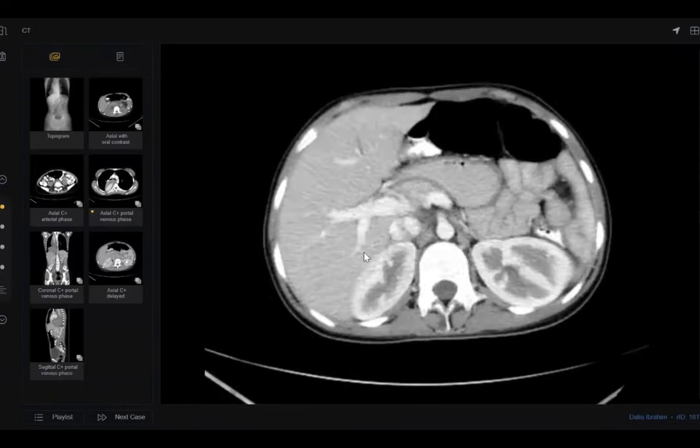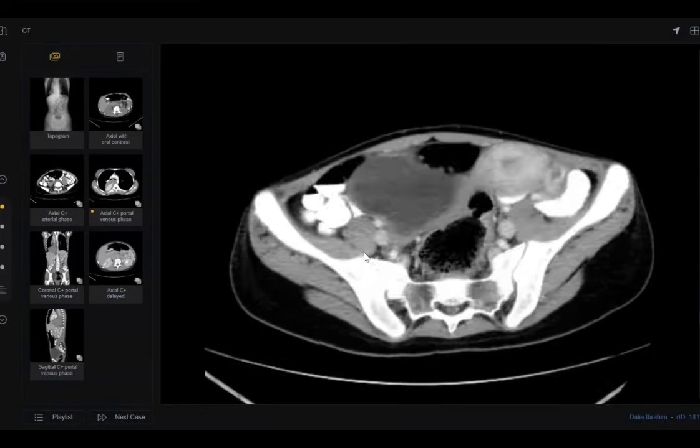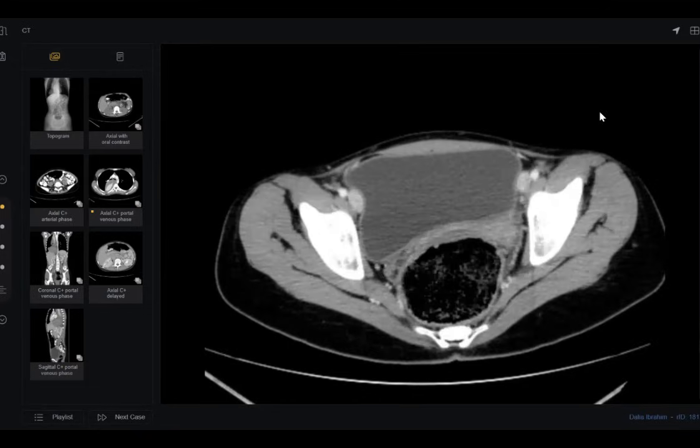When you go down, because you must go down, this is maybe a typical case of long cases, my colleagues. Why? Because the patient has a history of constipation. And if you go down, you will see at least marked dilatation of the rectum, marked distension. Go down, down, down.